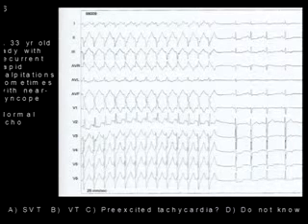So this is clearly a wide QRS tachycardia. It shows a right bundle branch block like pattern in lead V1. However, in V6 there is a deep S wave, which is unusual for right bundle branch block, an S wave so deep that the R by S ratio is much less than 1. And the most important are the limb leads, which show an extreme left axis deviation. The QRS axis is minus 90 degrees.